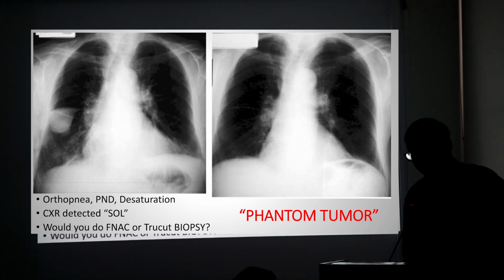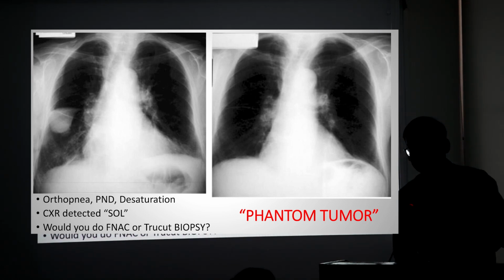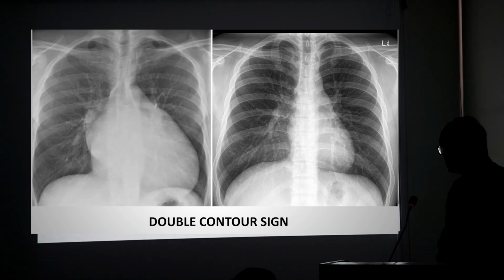Would you like to do a biopsy for this patient for diagnosis, or would you like to do something else? Yeah, we'll give diuresis. So this is a phantom tumor. There is an opacity, the fluid has accumulated in between the fissure, which is causing an SOL like this.